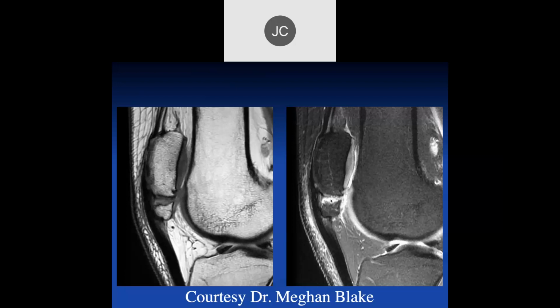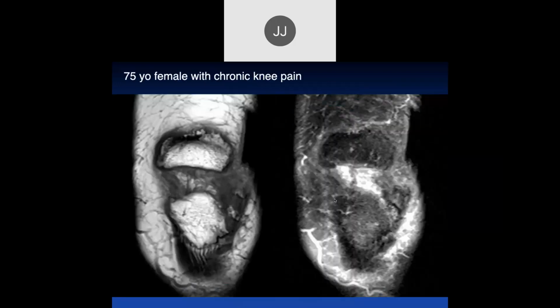So this looks like it's just a fracture of a prominent inferior pole. Actually, this one might work with a suture anchor, but I've never used a suture anchor in these. But this might cause me to do it.